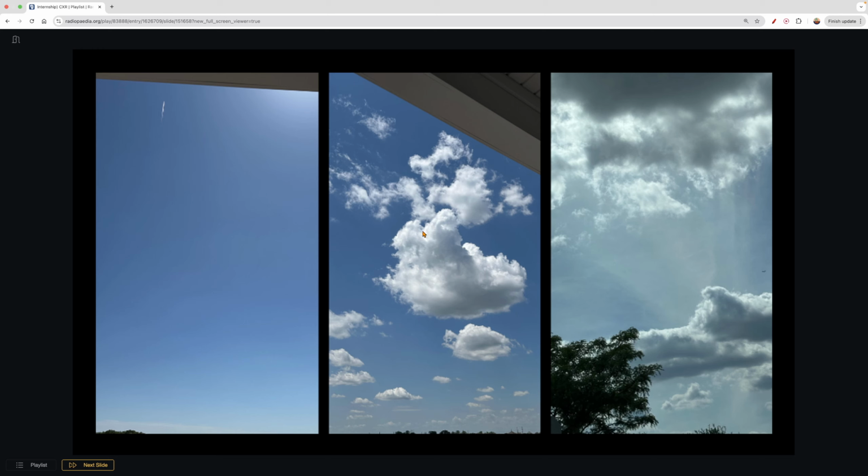And in terms of the quantity, you would say, oh, there's multifocal, right? There's multiple of these confluent or continuous opacities there. On the other hand, this image is a little bit more tricky, right? You can tell there's something here that's not supposed to be there. These guys, yeah, sure, we can see that all day, but something here is a little hazy maybe, right? It's not supposed to be there, but you really only know that this isn't supposed to be here because you know what normal looks like. This isn't blue, right? So that's how you would distinguish that.